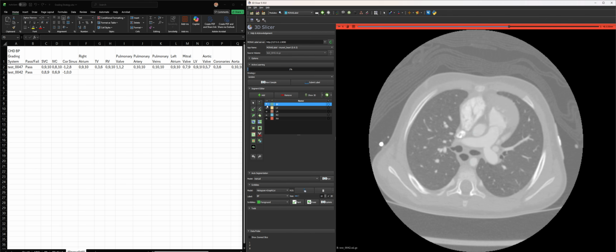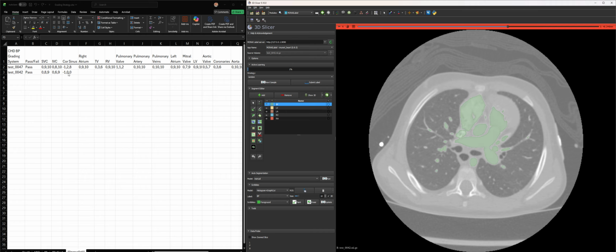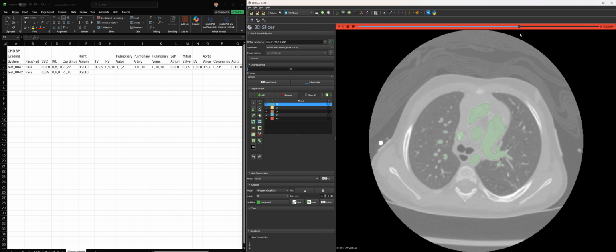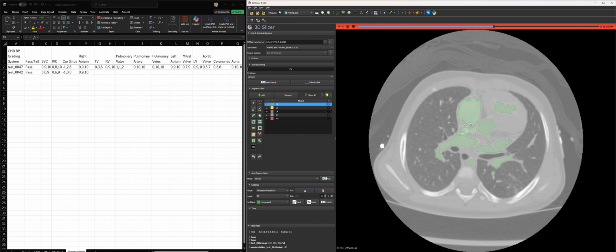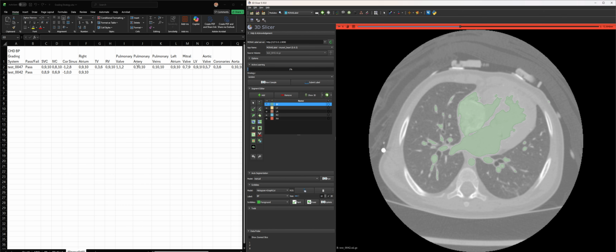What do you think? I think it's excellent. I'm going to give it a 0, 9, 10. Do I want to give it a 10? You know what? Yeah, because I'm going to say this is probably in the IVC or the SVC, not necessarily. I'm going to give that a 10 out of 10.